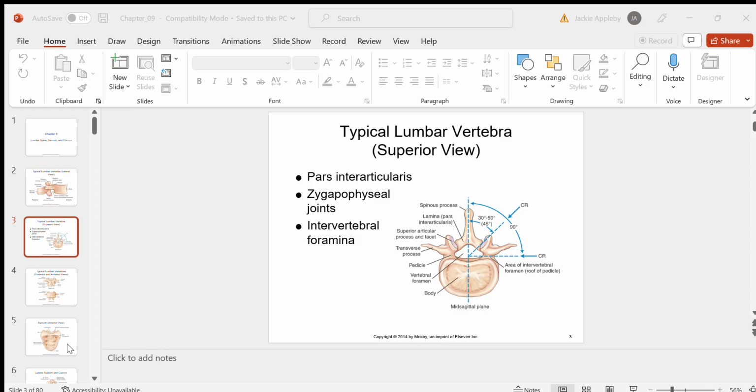I will parenthetically say the only thing I don't like about this is we don't include the entire sacrum in this image. Normally the entire sacrum should be included, including the lumbar 5 S1 joint space. Is that just a rule of thumb, or is that something that's... No, it's got to be included. Yeah, this is actually not a true image of the sacrum. Right. So you would want to see the L5 S1 joint space in every sacrum and every lateral sacrum. You want to see the whole bone in every image of the bone.